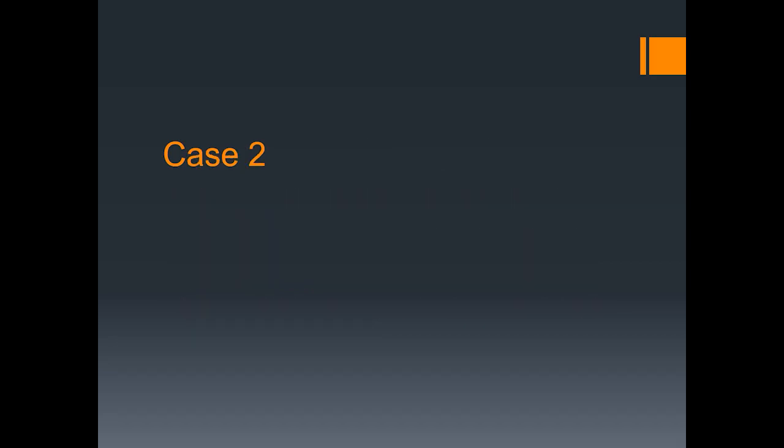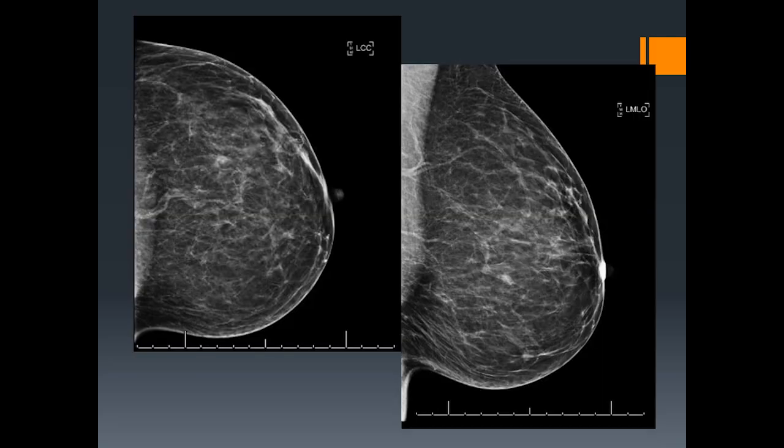Case number 2. A 49-year-old female presents for screening mammography. In this case, she's asymptomatic by definition because it's screening mammography. Immediately, we're going to think about concordance. This left CC and MLO 2D digital mammography is presented. Think about positioning, technique, and then possible findings.